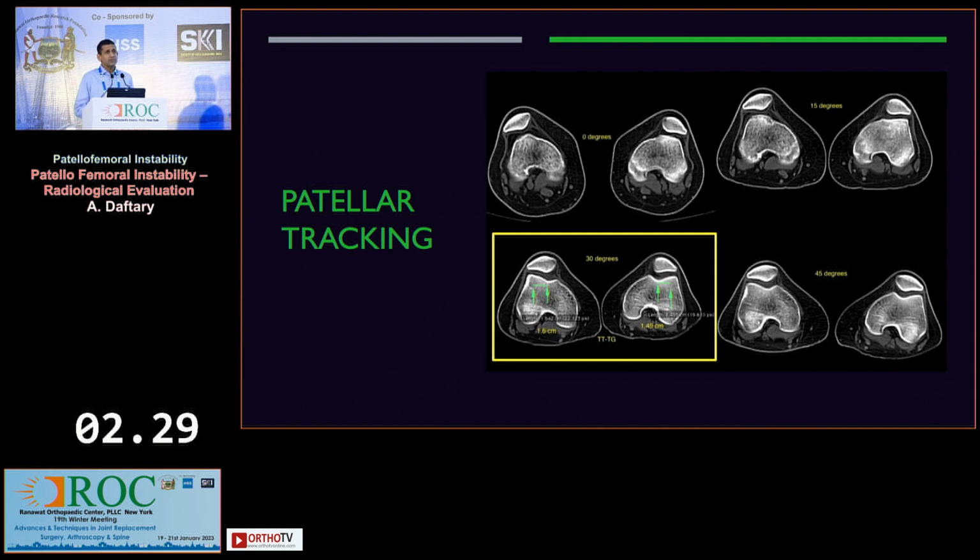There are some people who talk about this, and a lot of it is clinically assessed, but we do occasionally get situations where people want us to look at patellofemoral tracking. We can do this by CT or MR by taking them in various degrees of flexion and seeing at what point the patella subluxes out and at what point it flips back in. So these are two things that we end up doing for patellofemoral friction or tracking situations.